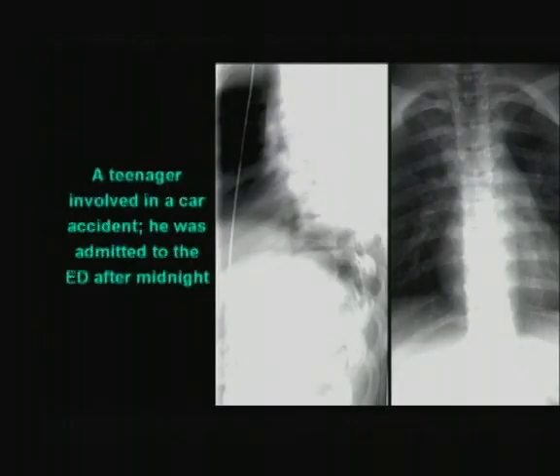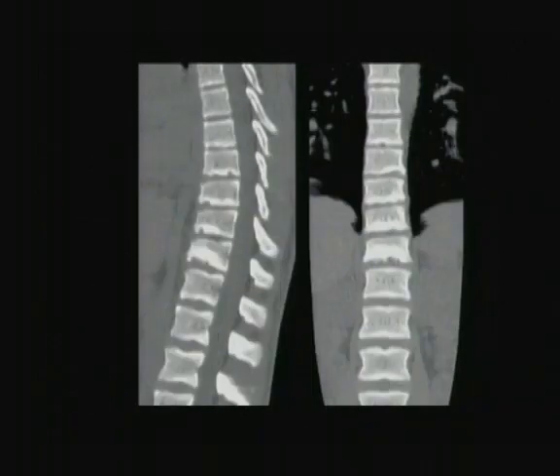Let me show you a couple of examples. These are recent examples here. A young patient was in a car accident, admitted in the middle of the night. The residents got excited about it, our residents and the orthopedic residents. And they admitted the patient and did CT. And obviously, these are multiple Schmorl's nodes, narrow discs, wedged vertebrae. This is typical Scheuermann's disease in an adolescent.